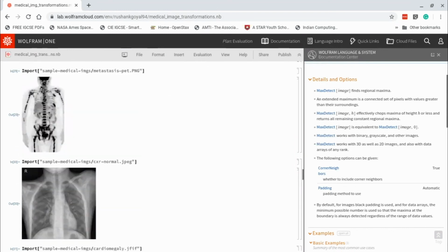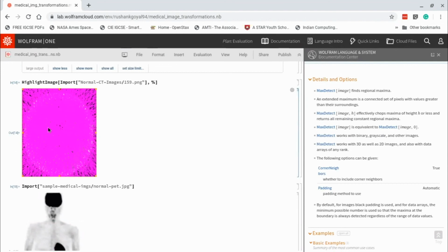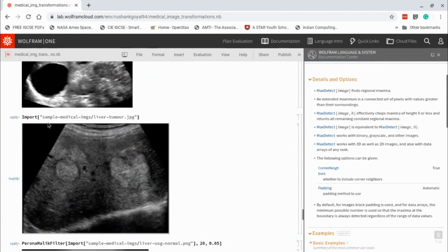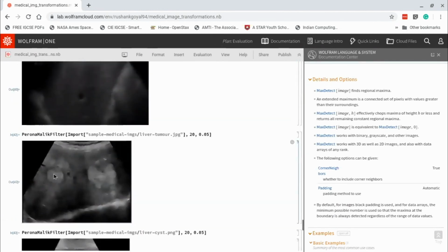So if I were to blur this image somewhere, it would create this black region around it because of that bug. If somebody applied that and you passed it through maybe the Perona-Malik filter, which highlights this black region, maybe that could help.